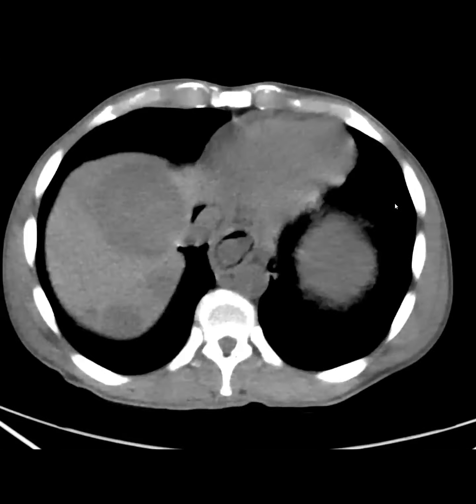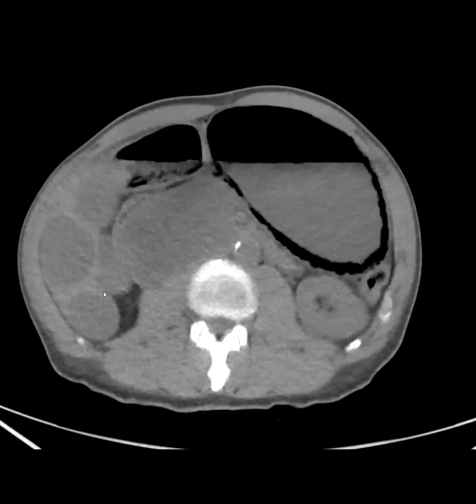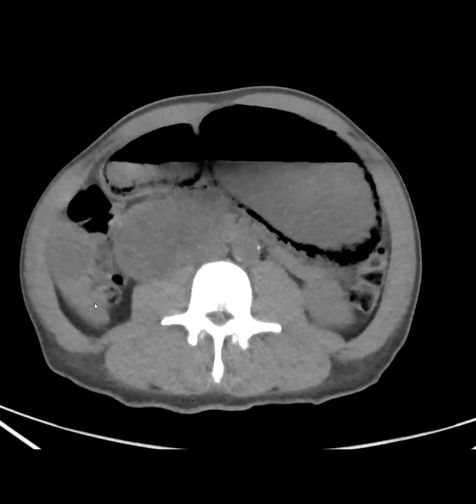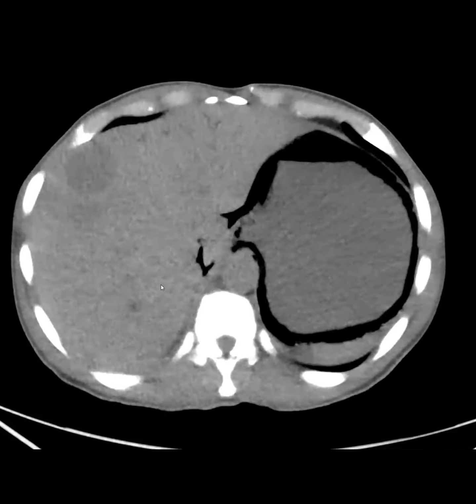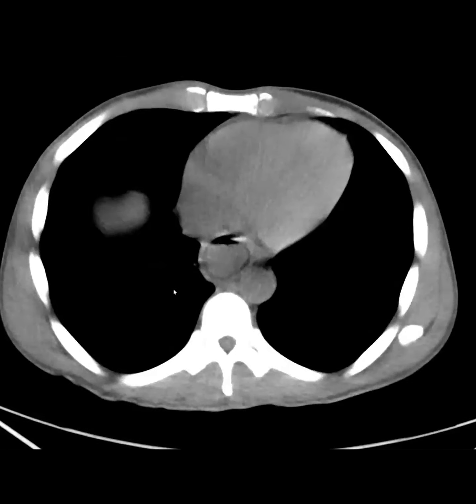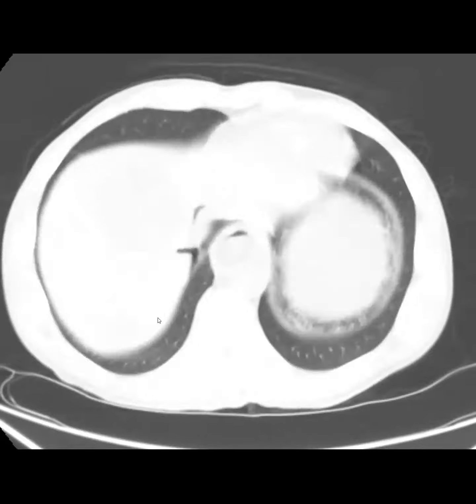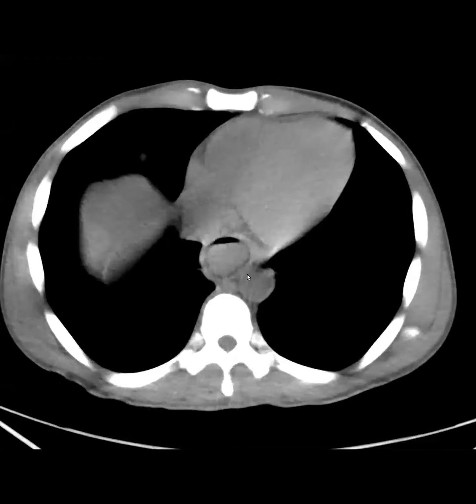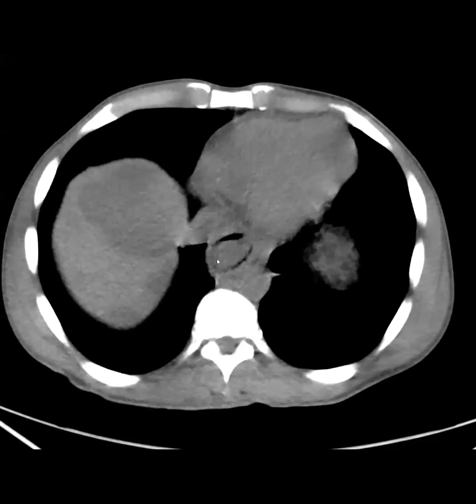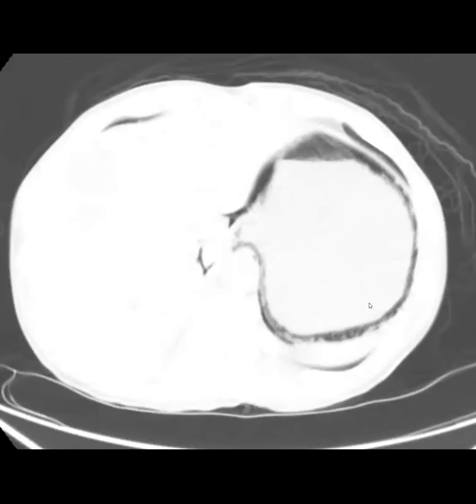Okay, so this is my case. It's a companion case. You can see that there's also a lot of large masses. This patient actually had a dedifferentiated liposarcoma of their leg with metastatic disease to the abdomen, including the liver, the portal hilum, and also lung mets. When sarcoma metastasizes, it likes to give you rounded, kind of hematogenous mets to the lungs. But the other incidental-ish finding was that there was pneumatosis of their esophagus and of the entire stomach here.